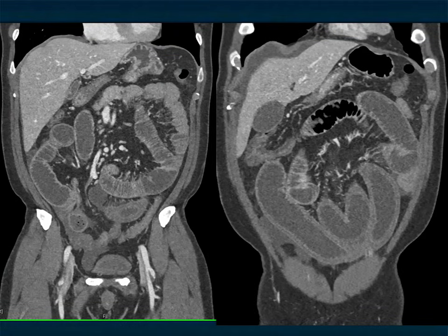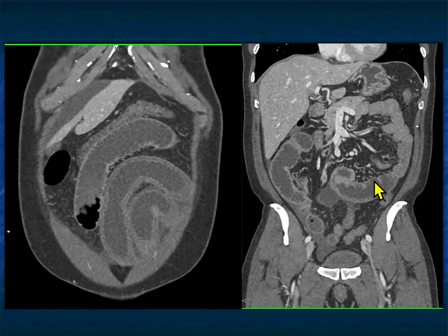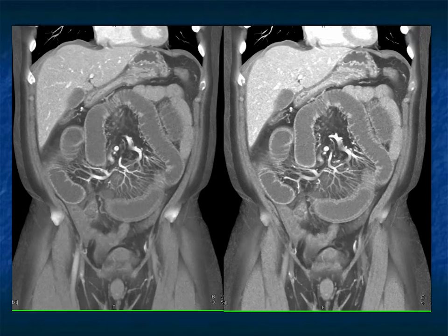And it's really impressive. Markedly dilated bowel, edematous changes. There's some free fluid in the right lower quadrant. And it looks like the transition is near the terminal ileum. And we're looking at it closer. Now, I showed you some infection, and you could say, well, maybe I'm holding something back. The infection that occurs in the terminal ileum by the ileocecal valve classically is tuberculosis. You have a stricture, and it causes bowel obstruction. And that's a thought, but this was not TB.